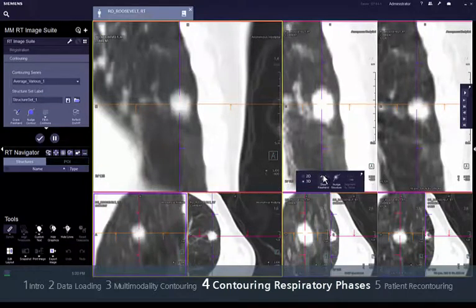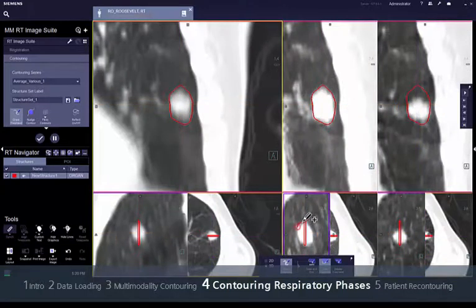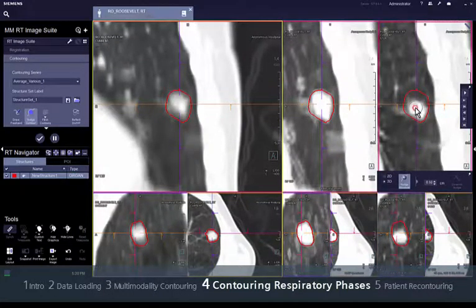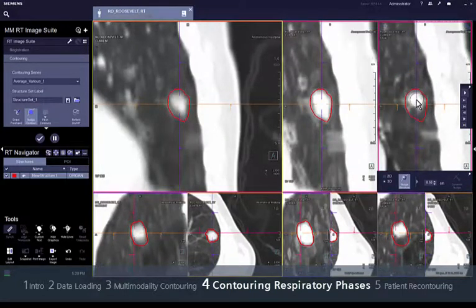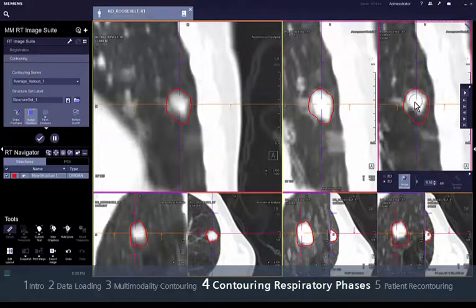Using the 3D freehand tool, the full tumour volume can be segmented by simply drawing the tumour extension in two orthogonal projections. Using the 3D nudge tool, contours can be refined using the single breathing phase information. As in the previous case, all displayed contours change as soon as you perform any changes, but they will be saved for the planning CT.